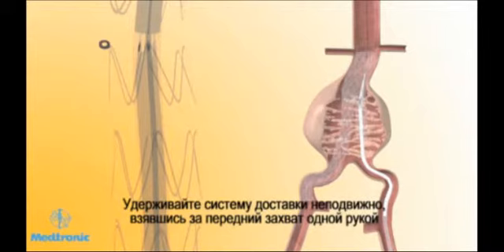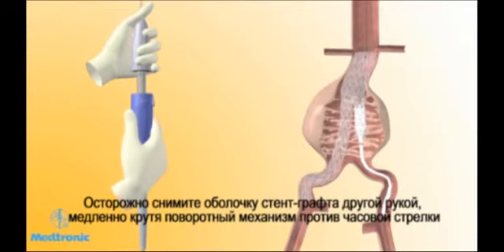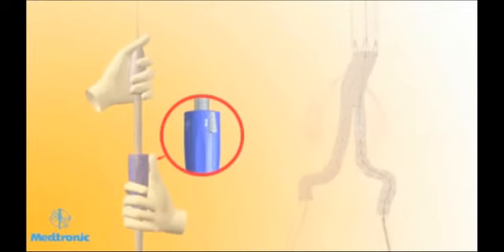Hold the front grip of the delivery system stationary. Then, slowly withdraw the graft cover with the other hand by rotating the slider counterclockwise. At any point, use your thumb to pull the trigger on the slider and pull the slider back all the way to finish deploying the stent graft.